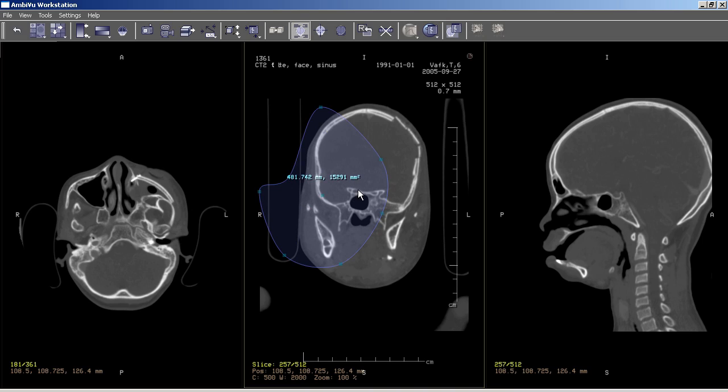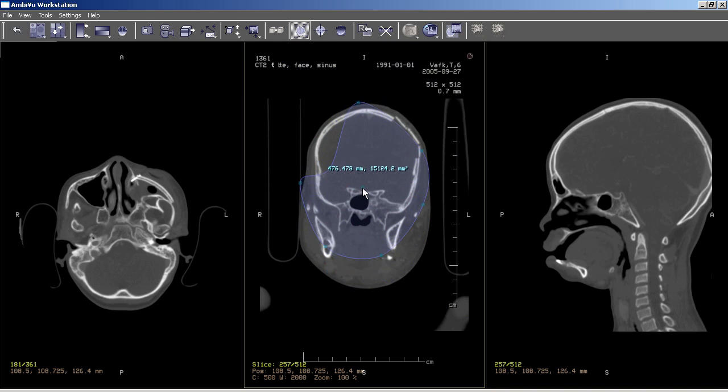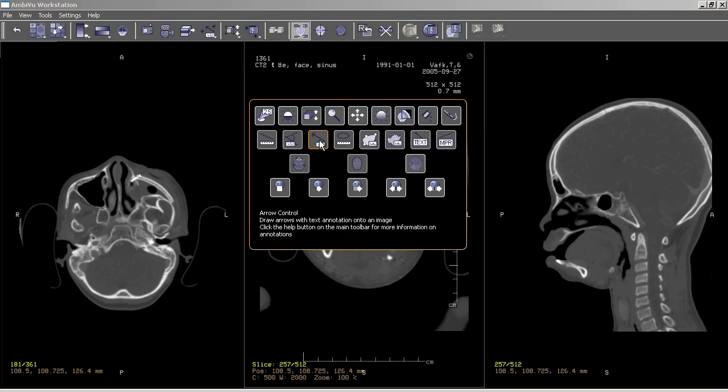All of these tools, if you notice, have the control points denoted by this green dot. If I click on this green dot and move, then the control point moves too. There is a green dot in the very middle of the annotation, and that's the same for all annotations. If I click on that, then I can move the whole annotation around. I can delete the annotation by pressing Shift and pressing in the middle, on the middle vertex. So I can do the same one here, for example.